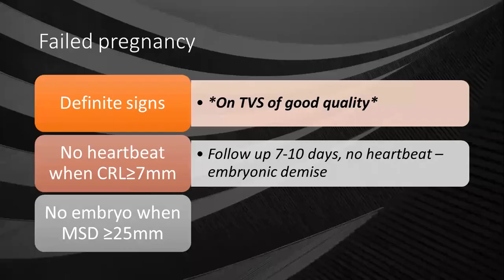Okay, moving on to failed pregnancy. So we're going to talk about the definitive signs first. And please take note that I actually put this in stars, that we are going to diagnose this using a transvaginal scan of good quality. We also have some transvaginal scans which are not of good quality. So please take note of your image quality. Take note of all the knobology that you have to play around with so that you have the best image quality possible for you to diagnose this.